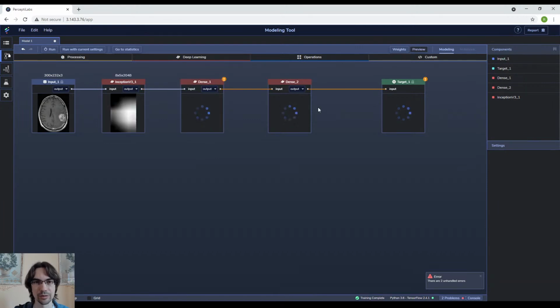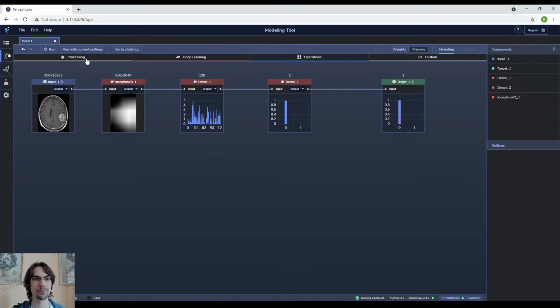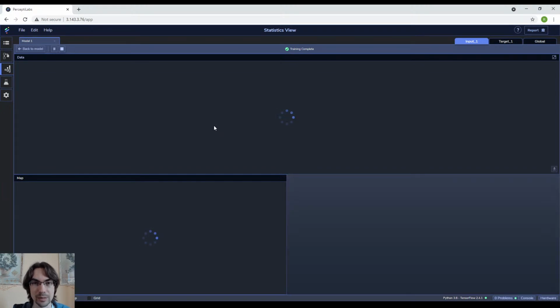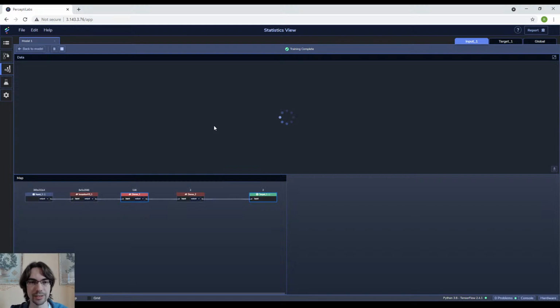Other things we can do is, of course, increase the number of layers. I'm a little bit hesitant of doing that since we're already starting to overfit a little bit with just these parameters. But maybe adding some nonlinearity would work in our favor. The other thing we can do is, of course, increase the dropout, or we can just reduce the number of neurons in this dense layer with 128.